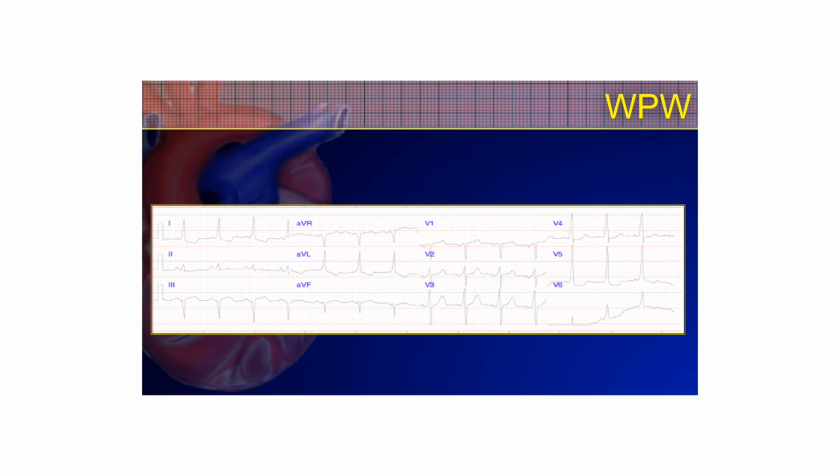Here we have another great example of a patient with WPW. Look here at lead 1, and you'll notice the trend. Lead 1 does present very often with a nice presentation of the triad: short PR, slurred upslope, delta wave, maybe a little bit of widening of the QRS complex. You could certainly see it again in V4, the shortened PR interval and the delta wave much clearer there as well.